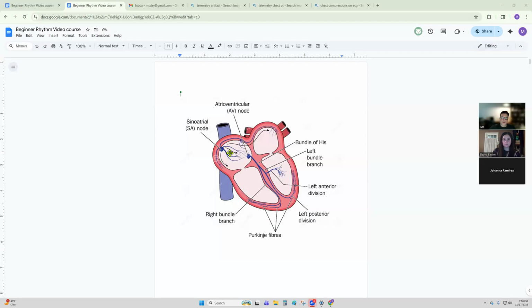So that would be an atrial ectopic beat, where you have some cell over here in the atrial chamber that fires. So the atrial chamber fires. You have a different P wave, but it's still going to be sort of positive and follows the normal pathway down through the septum to the Purkinje fibers.